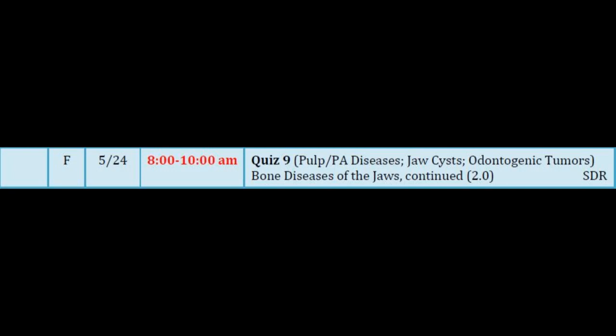The things that could be mixed tend to be clumpy and not uniform, with more opacity in just one part and distinct lucency somewhere else. So you should not suspect an odontogenic lesion for this. What about complex odontoma? Does this look like a complex odontoma? It's not quite dense enough. Those are really dense. Bone is not as dense as tooth structure. So these are less dense, and they first arise in young adults, whereas odontomas arise at an early age. So you shouldn't get it mixed up with a complex odontoma either.